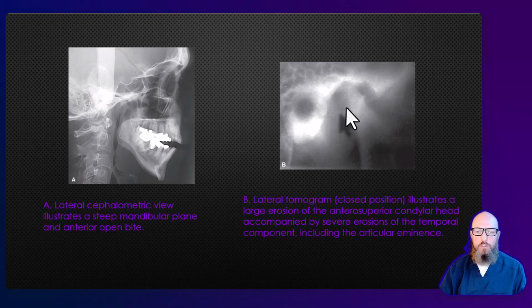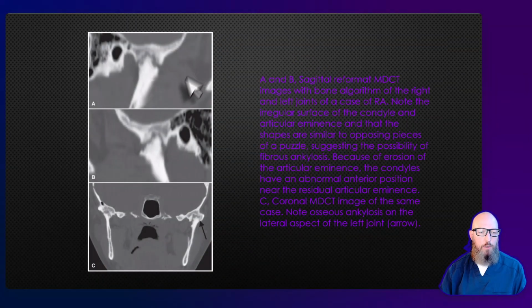I think it was a more severe form of osteoarthritis. Osteoarthritis doesn't do this as often. Usually it's more just flattened from the top. And so that could be a unique thing about it. These are some images showing varying degrees of ankylosis. See how sclerotic this bone is? And we said rheumatoid tends to be more of an erosive disease, but it can kind of exacerbate osteoarthritis.